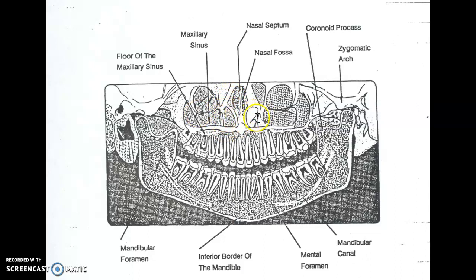So that's kind of what that was showing you there. The coronoid process here, and then this is the condyle. You've got your zygomatic arch, and this looks more like it does in an actual skull. The intraoral image catches a cross section of it and distorts it a little bit because of that really steep vertical angle that we typically have.